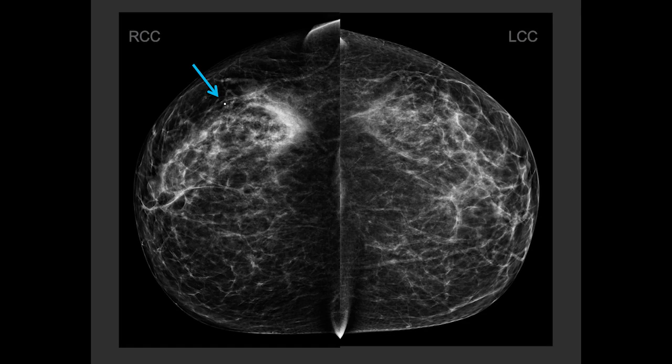Next, we move on to mammogram. Even though the patient is under 30, we will move on to a mammogram in the case of a very suspicious finding. And we do a bilateral mammogram. This is in part to begin the extent of disease workup and make sure there is nothing in the other breast, and also to determine if there are other lesions in the breast with the focal symptom.